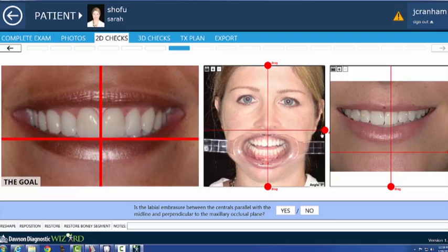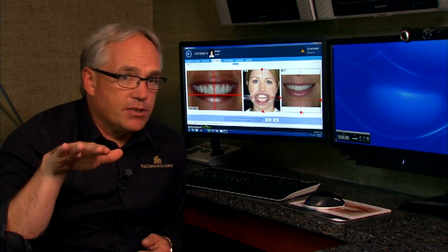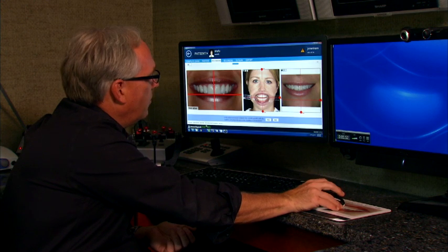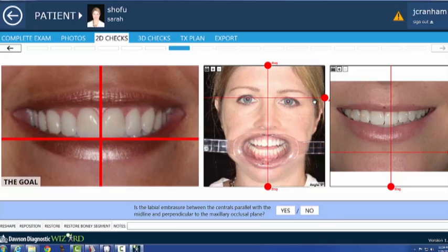But one of the things we notice is that her maxillary occlusal plane is absolutely parallel to the floor. There are no cants, which is something that we want to look at. So that's what we're looking at. This is her pupillary line with her occlusal plane to see what we can see here. And then also notice her lower incisal plane looks pretty good.